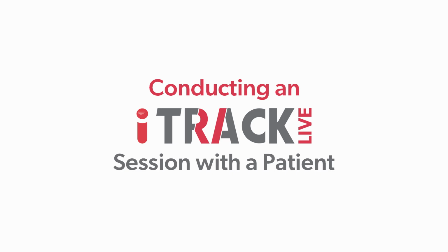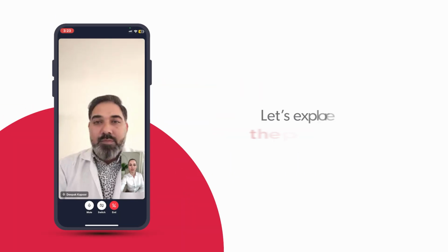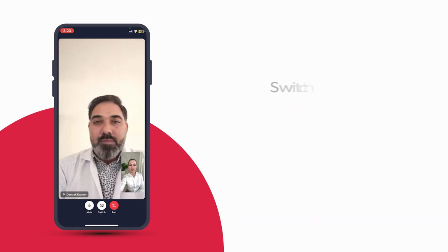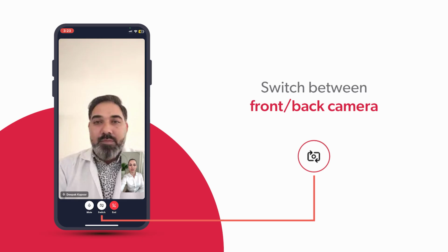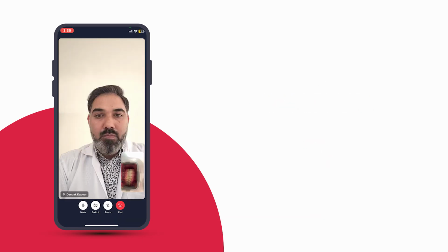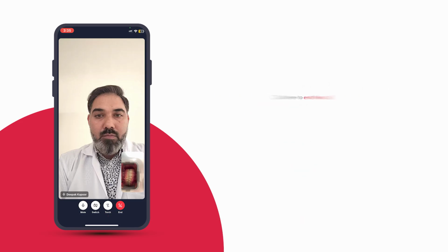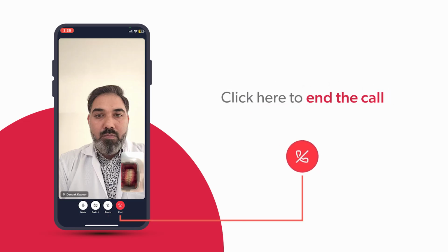Now, one by one, let's explore all the exciting AI-powered functionalities of TrackLive. Let's explore the patient's interface first. Using this button, the patient can mute the call. Click here to switch between the front and the back camera. Once you switch to the back camera option, you will see an additional option of torch. Click on the torch button to switch on the flashlight. Click here to end the call.